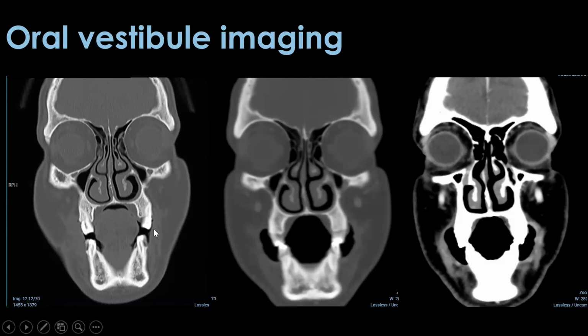Again, this is the same patient that we just saw. These are the coronal reformats. As I said, symmetry on the right and the left side. We can see that the curvature here is slightly effaced. So the buccal mucosa, there is also soft tissue thickening here, which is enhancing on the left compared to the right. So normal soft tissue also enhances.